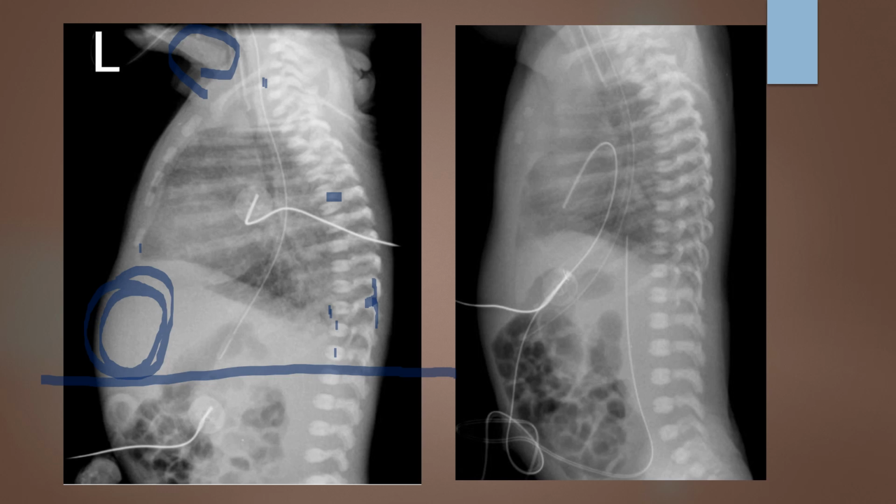That tells us that our mid-coronal plane is really pretty perpendicular. If we come up here and look at the sternum, we see that both sides of the sternum are superimposed. So we get it in nice profile. I don't see any heart or any air in front of that sternum. So again, our mid-coronal plane checks out.